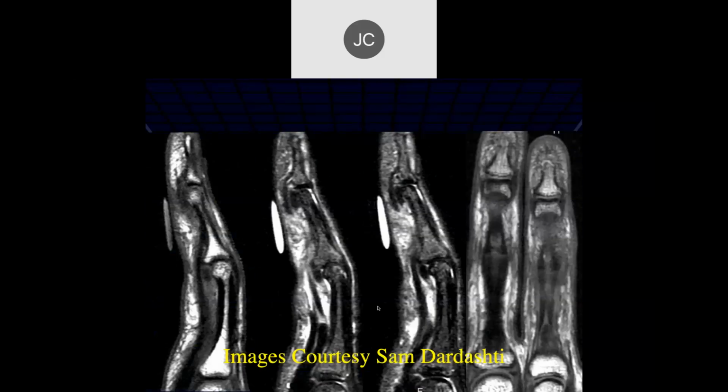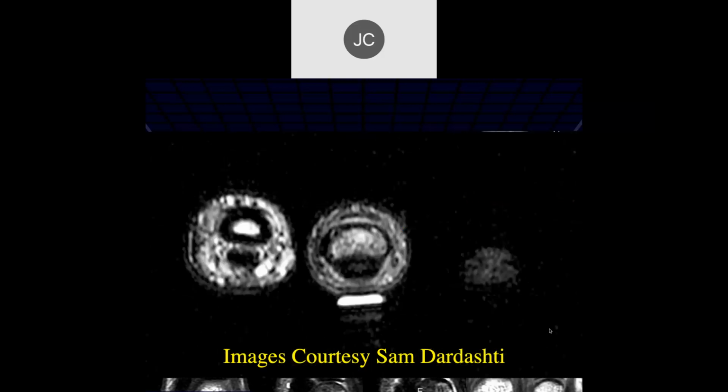All right. So here, looking at the volar aspect of that second metacarpal, it looks like there's a complete tear of the tendon. It looks like it's both tendons, at least in this plane, or the profunda at least. And if we go to the coronal images, you can actually see the retracted end of the profunda tendon here. That's no man's land. That's not fixable right off the bat. You have to wait before you fix this one.